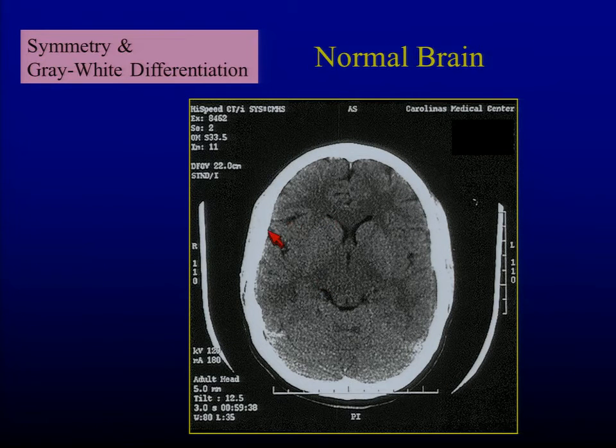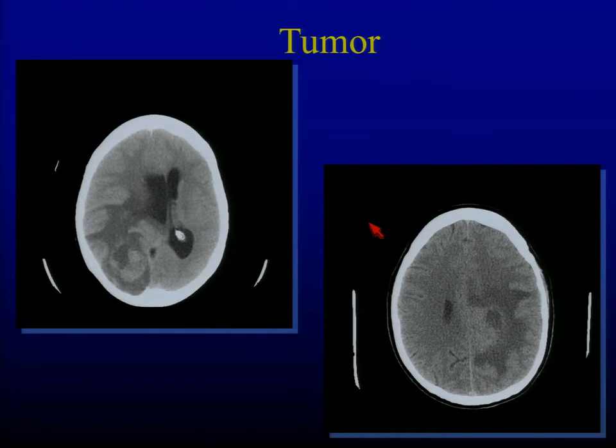The other thing that I'm looking for when I'm looking at the brain is side-to-side symmetry. Frequently, stroke problems in particular are a unilateral problem, which is fortunate, so I can compare one side to the other and decide is it similar or dissimilar. So what are the things that I can find? Again, there's some really obvious ones. So this is one, nobody's going to miss this one here.